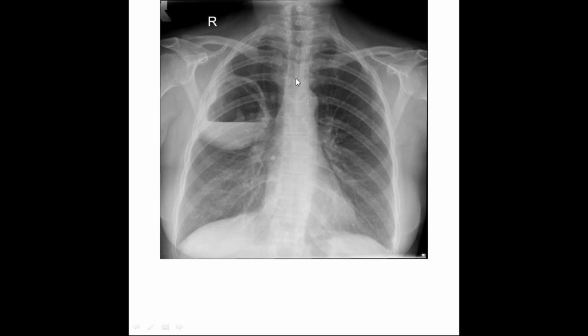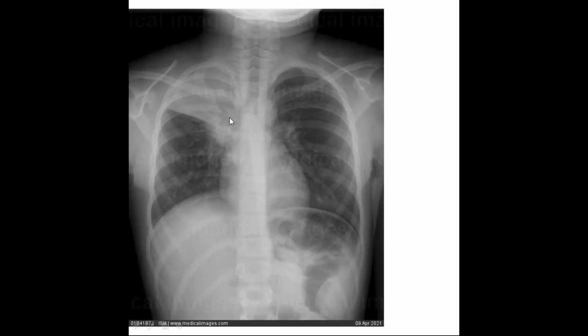So we come on to this. Yeah. So again, airway is fine. If you go for the breathing, what you're seeing in the right hilar region is only the upper lobe. If we talk about this X-ray, the hilum is slightly distorted in this region because of the upper lobe consolidation. It is not a classical Silhouette sign, but Silhouette sign is commonly attributed to the cardiac borders. But if you compare this hilum to this hilum, you will obviously see that there is some opacification. So that could be a possibility because either the opacification is extending to this region or it is sort of a Silhouette sign.